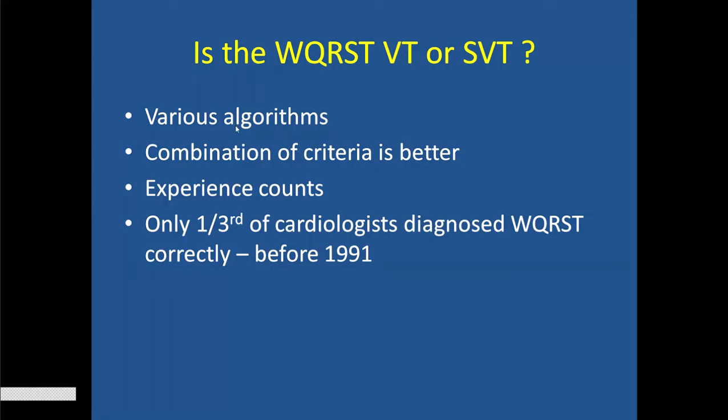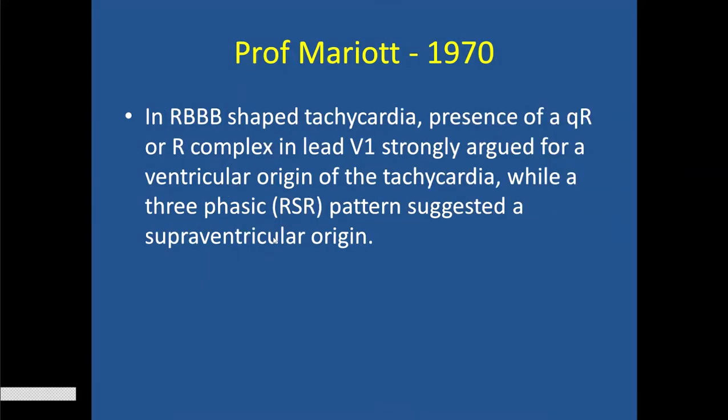There have been various algorithms, there have been combinations of criteria which have been found to be better, and with all this, experience counts. Before 1991, only one-third of the cardiologists were able to diagnose VT correctly when given a wide QRS ECG.